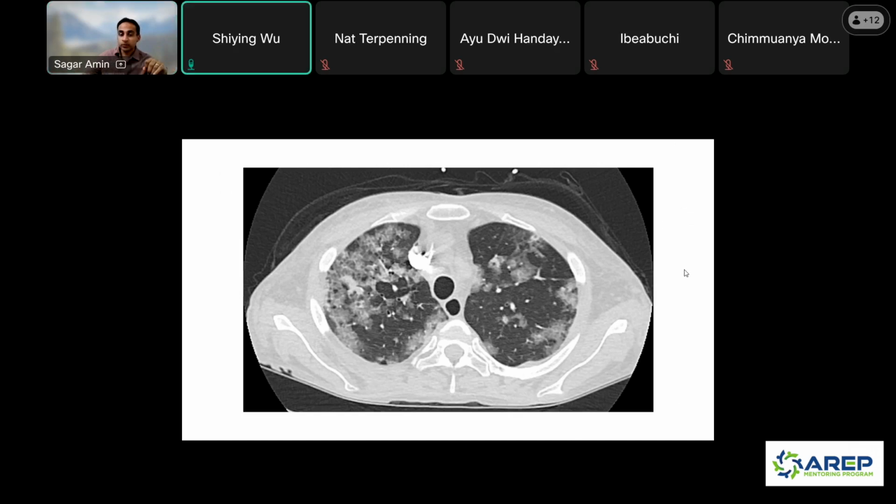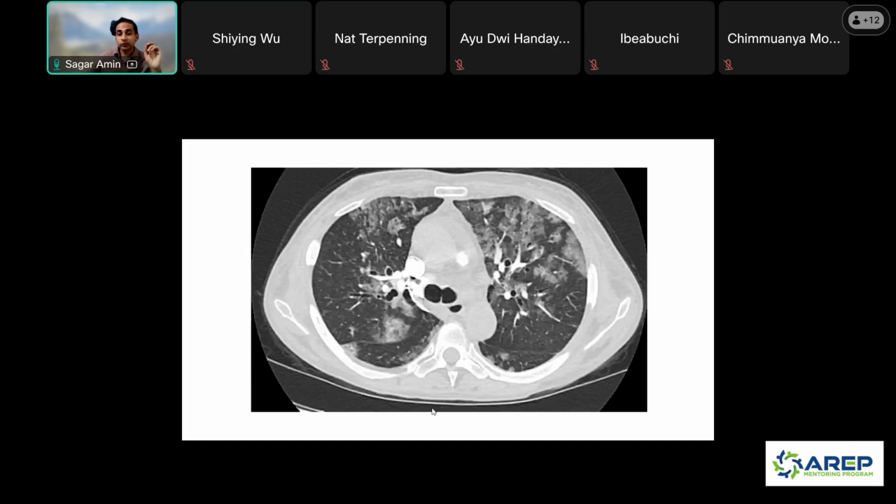Hypersensitivity pneumonitis. Yeah, that's a good suggestion because of all the ground glass, right? It's more upper lobes, so the distribution's correct. I would say that there's probably no air trapping. I didn't give you enough images, like expiratory imaging, to show you if there's air trapping or not, but just for the sake of this case, I would say that there is no air trapping. You just see ground glass opacities in the upper lobes. So it's unlikely to be hypersensitivity pneumonitis.